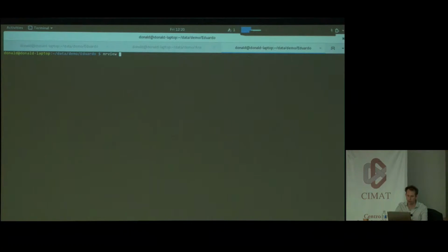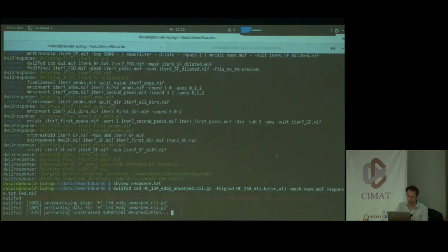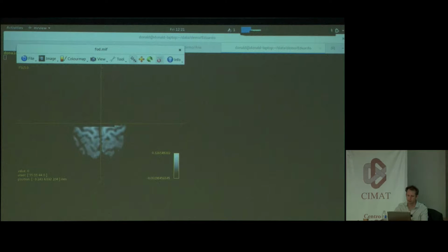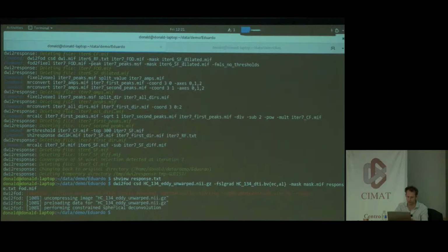If you're bored, you can actually have a look at the output. Oh no, you can't these days, it's done differently. Oh no, we might be able to. I'm just trying to think if that will work. Yes, it will. You can actually see it on the fly, filling itself up. This is the beauty of memory mapping for those geeks in the audience. You can see it actually happening.